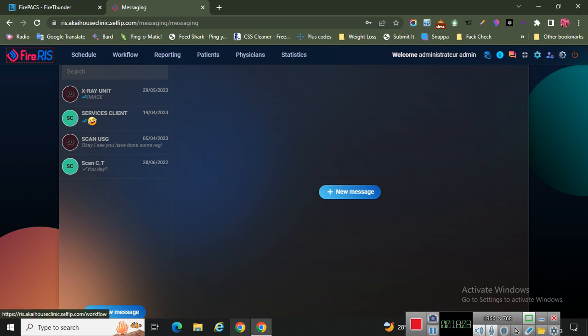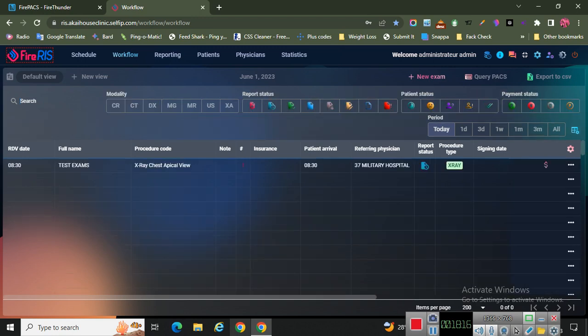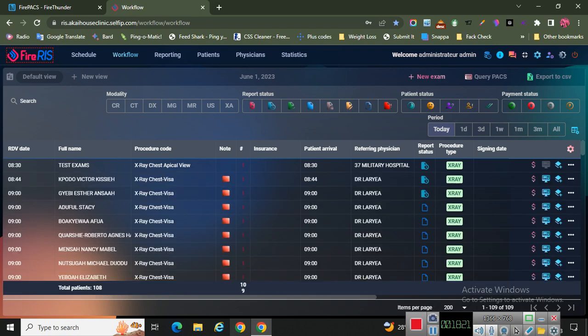But the whole idea is to have a backup of all our reports on the system, so we can easily refer and print them as and when needed. If you have any queries or questions, please send a message from the chat bot.